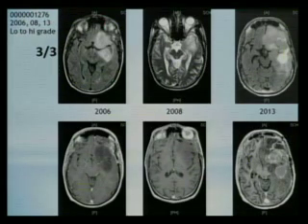So what is the hallmark of a malignancy in the brain, primary and secondary? It is mass effect, edema, enhancement, which is usually in the periphery and irregular, central necrosis, hemorrhage sometimes, and occasionally calcifications.